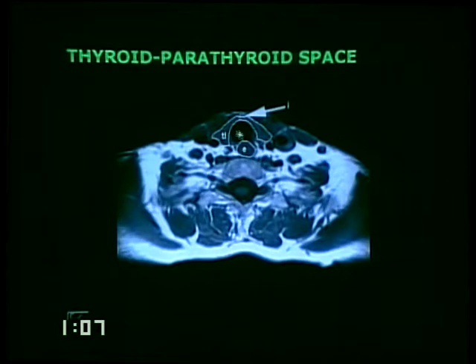The thyroid is made up of the left and right thyroid lobes, but don't forget the bridging isthmus between these lobes. You can have occult tumors only in the isthmus and not in the lobes, and you're going to miss it because you're not recognizing that as part of the thyroid gland. This is the number one missed area for thyroid pathology. The second area that we miss is when we have ectopic thyroid in the anterior superior mediastinum. Remember to identify the left and right lobe and the isthmus in every CT or MR of the neck.